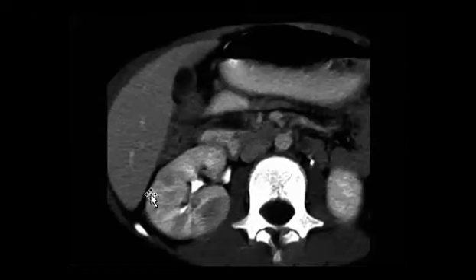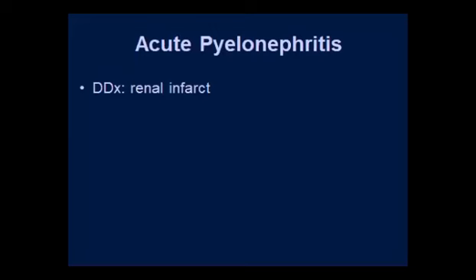Again, when you find this striated nephrogram, maybe with poor contrast enhancement medially, it can be pyelonephritis, one of the good differentials. Yes, Marwa, Fawzi. Okay.